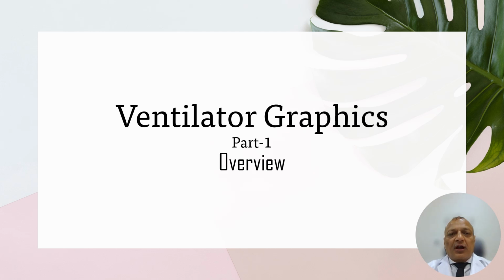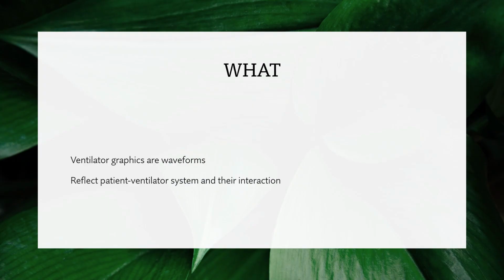In this video I will be discussing part 1 of ventilator graphics. What is ventilator graphics, how is it useful for healthcare professionals working in critical care settings to know about them, and what are the different types of ventilator graphics. Ventilator graphics are waveform or graphical presentation of ventilator, patient and their interaction to each other.